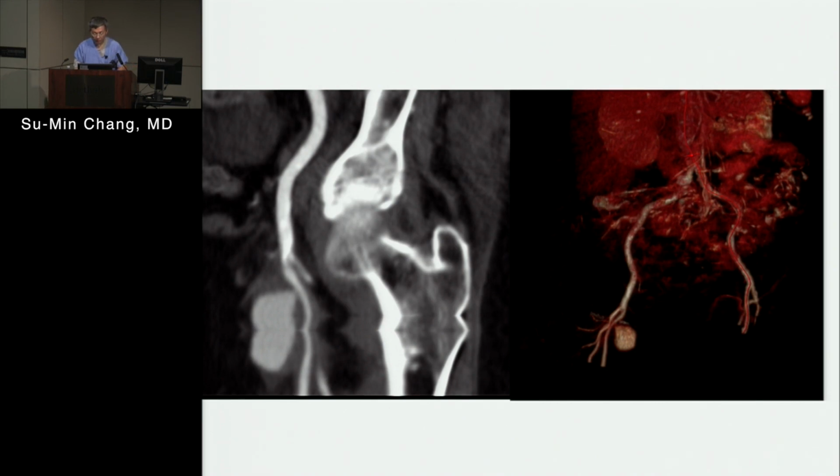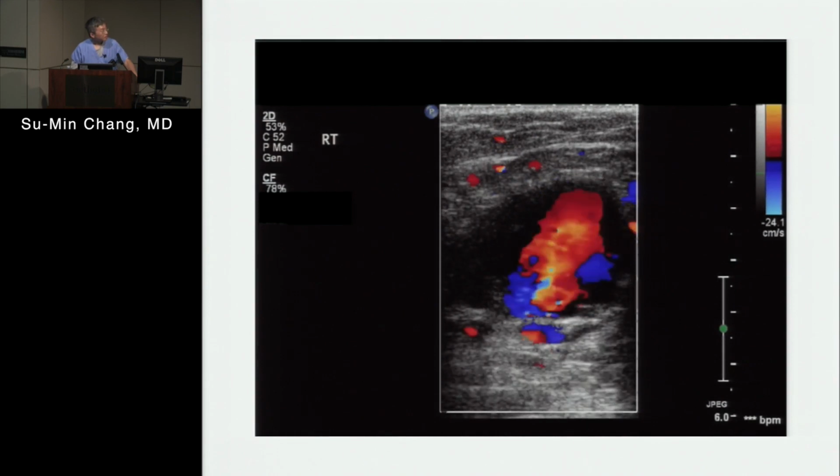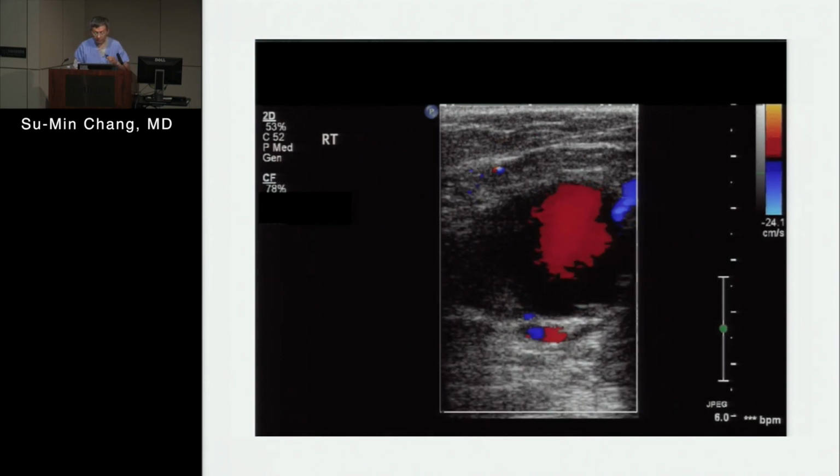This is 3D rendering, so it's very big, right? So nobody probably leaves it alone. You probably want to do something. And she has some tenderness in the area. Okay, this is a vascular ultrasound. Have you seen it now?